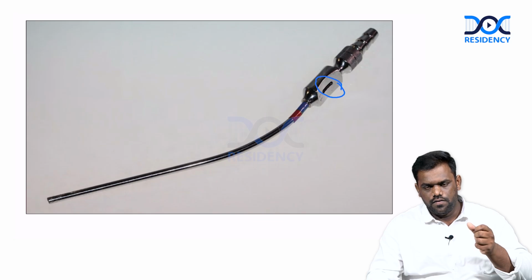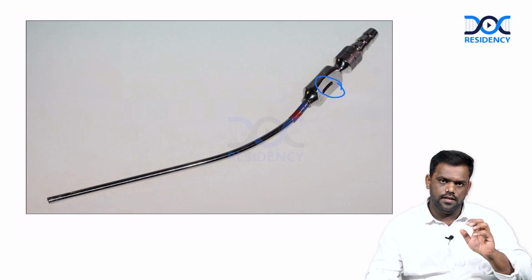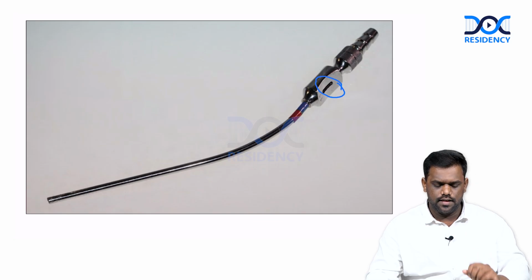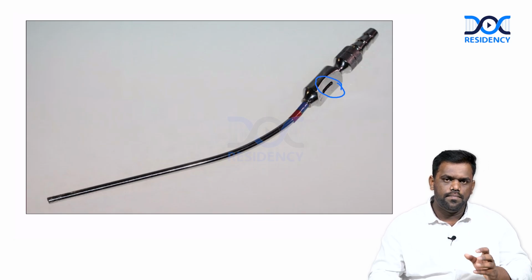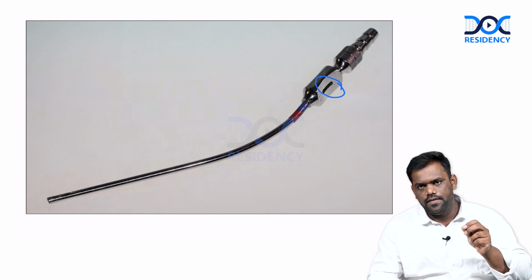Negative force will be more if you block the hole, and if you open and do the surgery, the negative pressure will be very less, okay. You can use it depending upon the vital structures and areas. Suppose you are going to operate on very vital structures, then we should not close the hole. We should open the hole and do surgery because it will suck all the material.